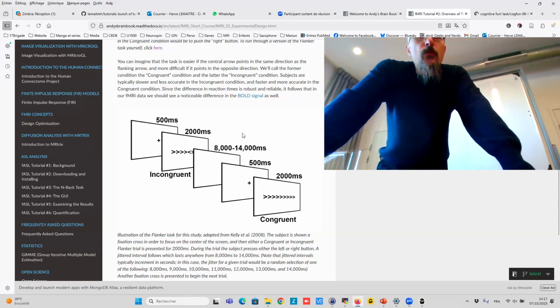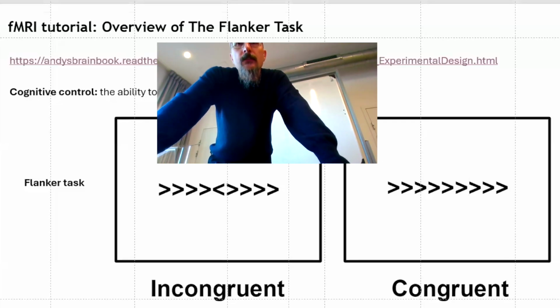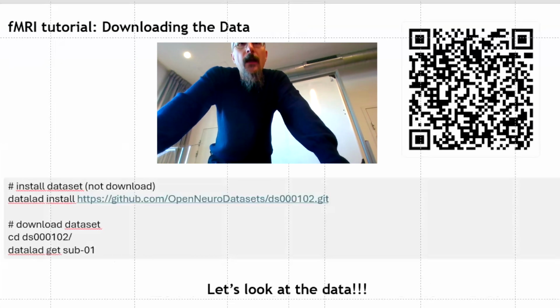And at the end, you will do a contrast. That means you will look at the difference between incongruent stimuli versus congruent stimuli. So it's what we will try to do today.